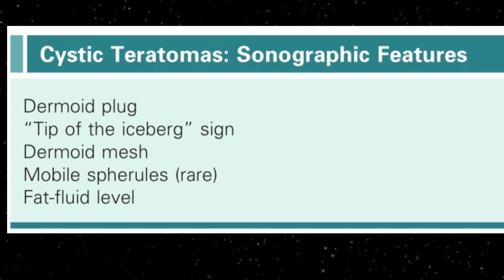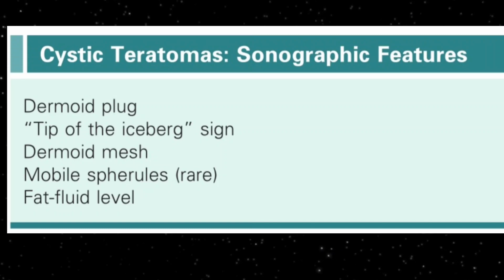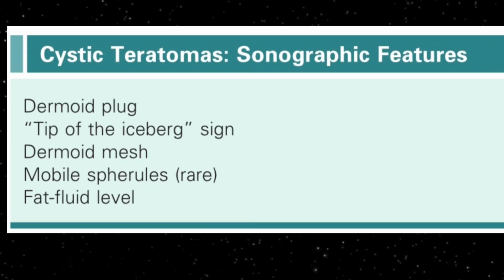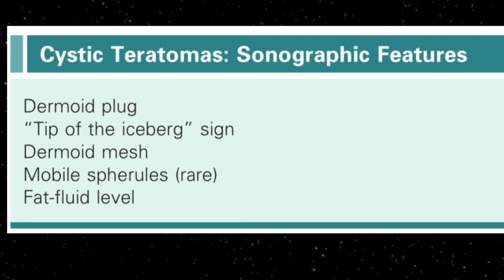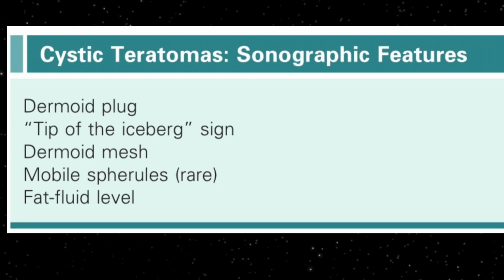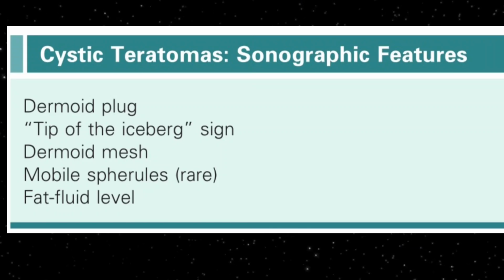It has its own particular radiological appearance. Very rarely you may be able to see mobile spherules, and fat fluid level is the commonest sign. So let's start watching these images and appreciate all these features to confirm the dermoid, or in other words cystic teratoma.